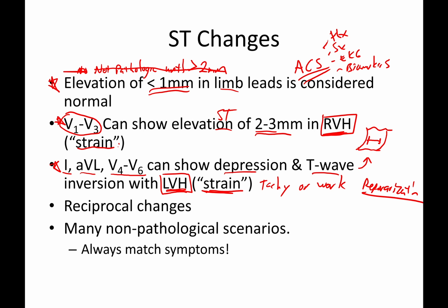Reciprocal changes, there'll be much more depth in this, but it's the idea that looking at the heart from a different angle and seeing the same effects. And that one's a little tricky.